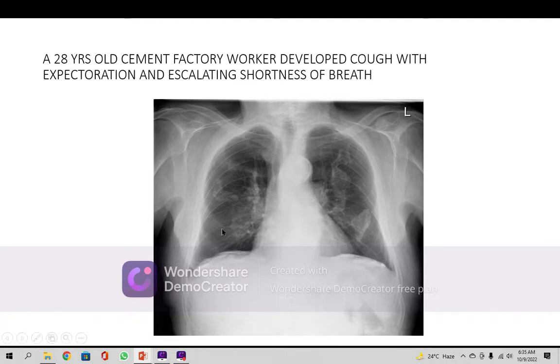The problem is seen in the lung fields. The trachea here is going on like this. The upper zones, the first intercostal space with the first, the second with the second, the third with the third, the fourth with the fourth. In this fashion you go downwards. And then you see the costophrenic and cardiophrenic angles and the dome of the diaphragm. And this is the middle mediastinum, the cardiac shadow.